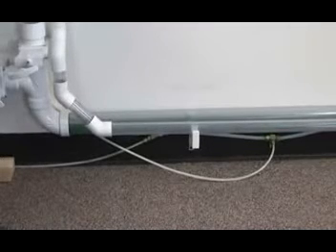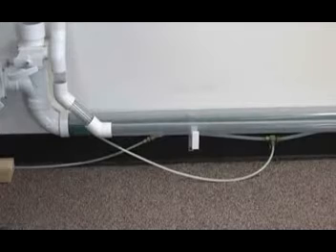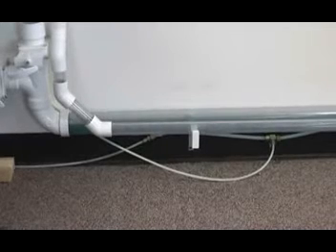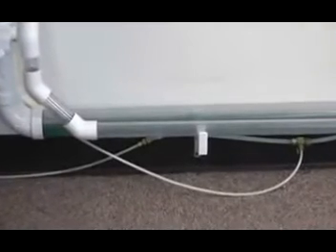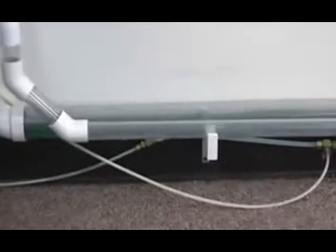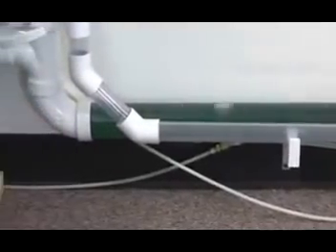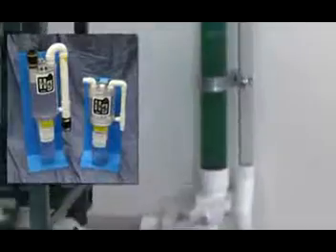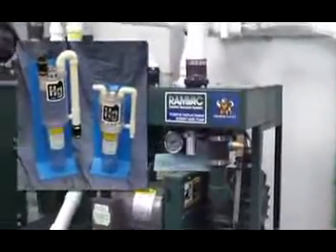As the liquids are introduced, it takes quite a bit for the pipe to fill up before the riser that comes up to the collection tank will allow the liquids to come up. The liquids will come from the main trunk line up the riser, which would be coming up out of a concrete floor, into an amalgam separator that's located by the collection tank, and then through the amalgam separator into a collection tank.